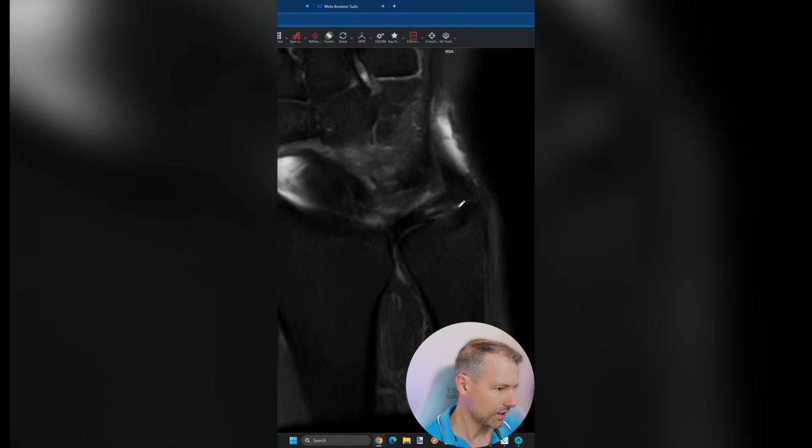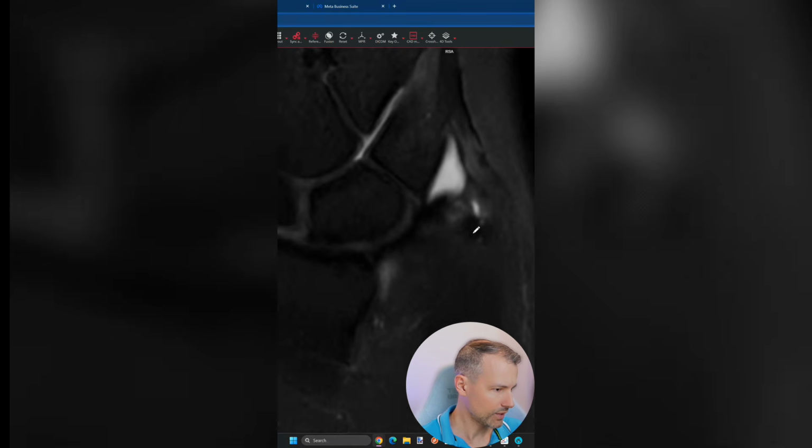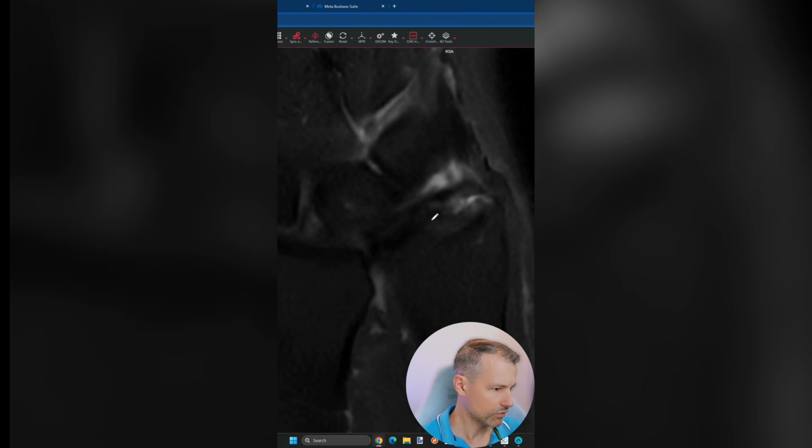And then I think you are correct that there is some interstitial tear component into the disc periphery here. And I think the foveal attachment is a bit hard to assess. I don't see fluid transecting it somewhere here. So that's why I would probably also go, as you said, that it's intact.